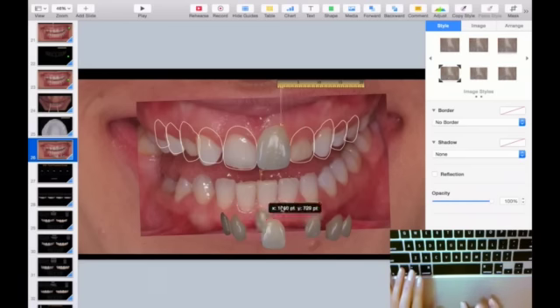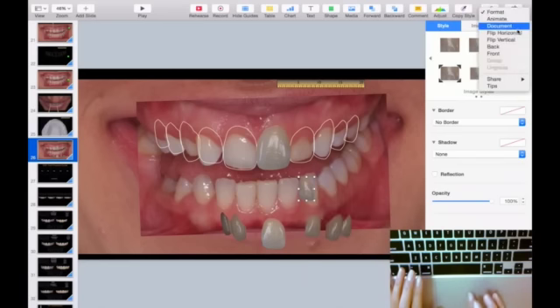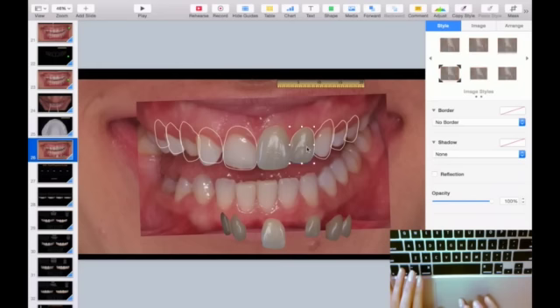I think I prefer this one. I'll flip and I adjust it to the right size, just a little more. And do the same with my K9.